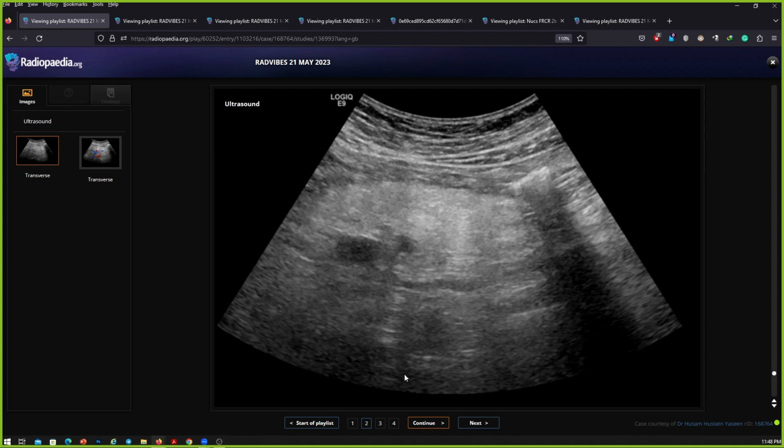Just to finish with this image, sometimes they might show you this kind of an ultrasound image, just an echogenic avascular mass-like hyperechogenic area or a lesion. So remember, it can be shown. I personally don't think it's a very simple one to give a differential with this particular image, but the differential would still be omental infarction, mesenteric panniculitis, then mesenteric inflammation due to other causes. Maybe others can chip in a few more differentials as well.